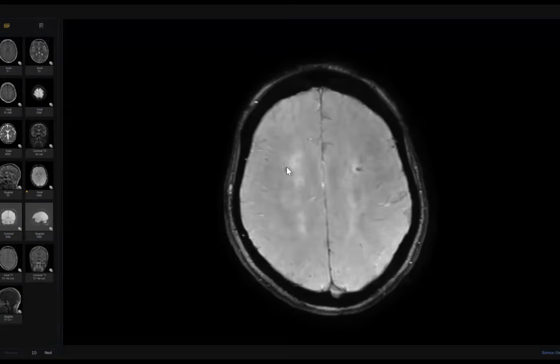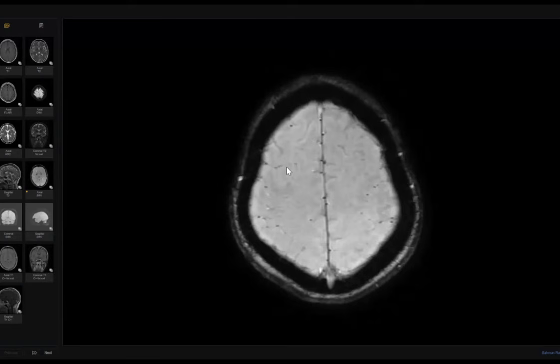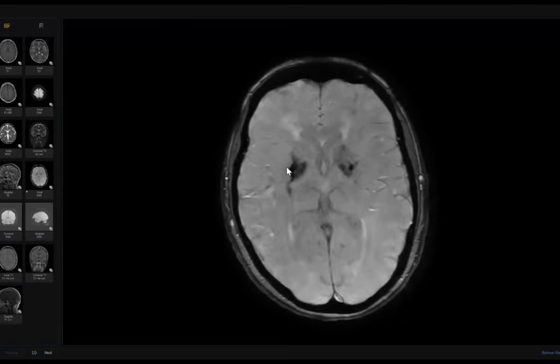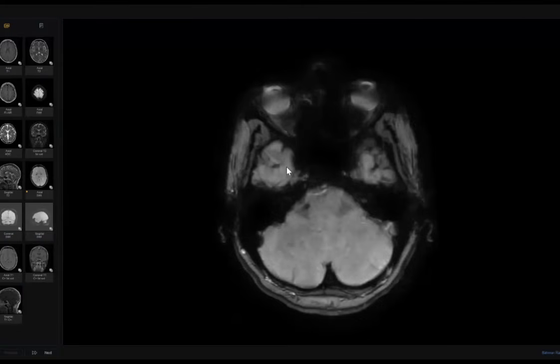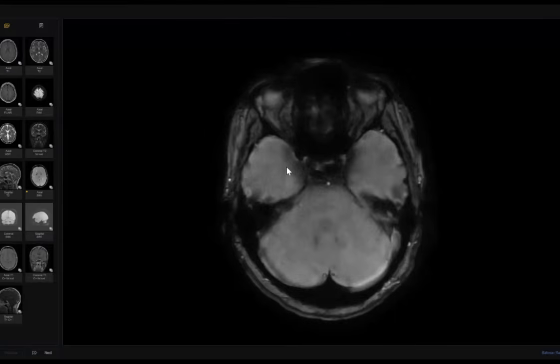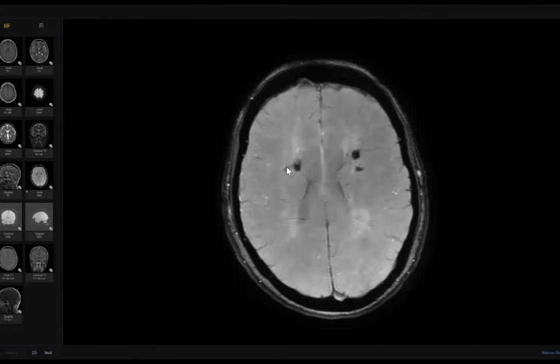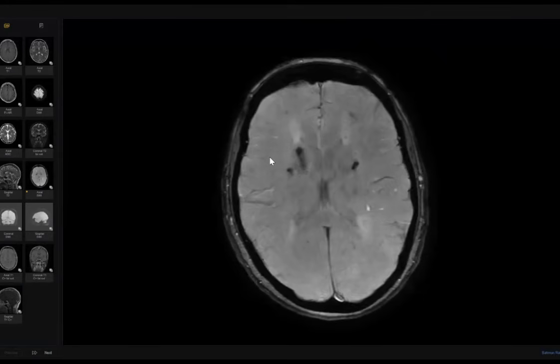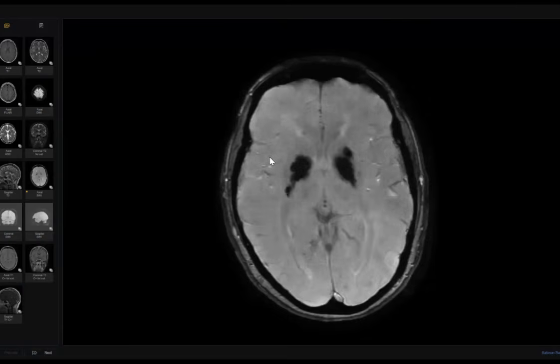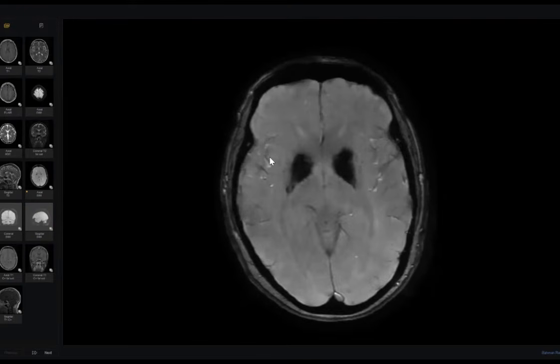By the way, maybe also calcium. I just asked you, I didn't mean that you are wrong. You may be correct. I want to see if you will insist in your answer or not. Because it was high in T1, this is a paramagnetic effect. Could be depositional due to mineralization.